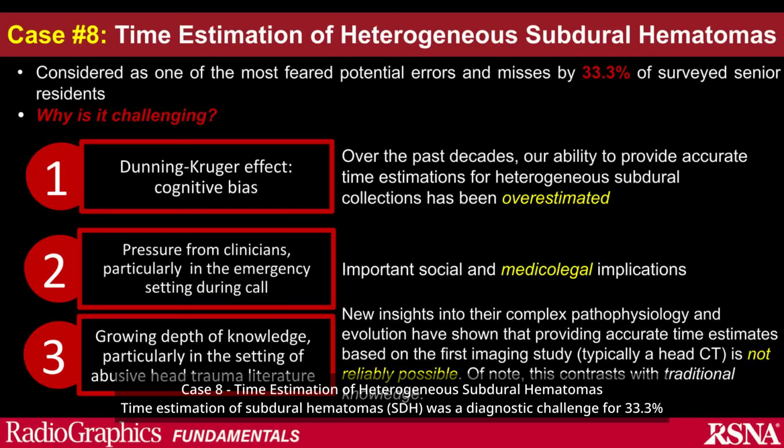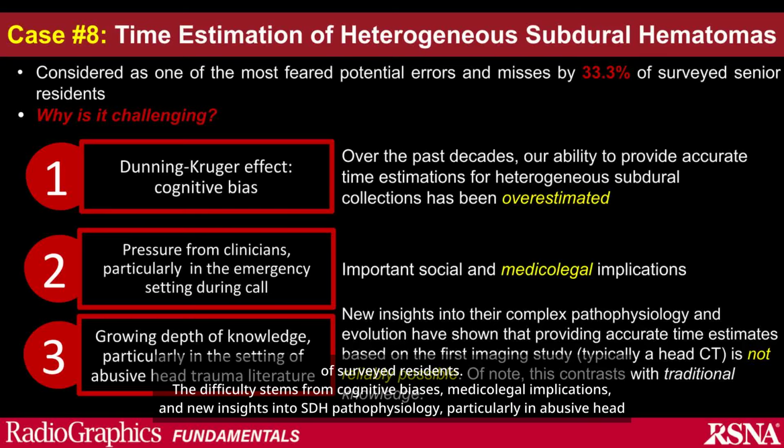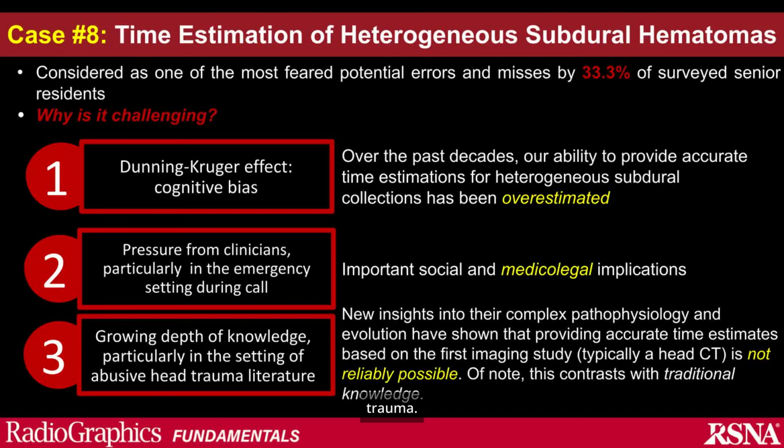Case 8: time estimation of heterogeneous subdural hematomas. Time estimation of subdural hematomas, SDH, was a diagnostic challenge for 33.3% of surveyed residents. The difficulty stems from cognitive biases, medico-legal implications, and new insights into SDH pathophysiology, particularly in abusive head trauma.